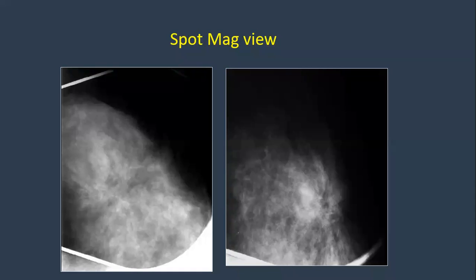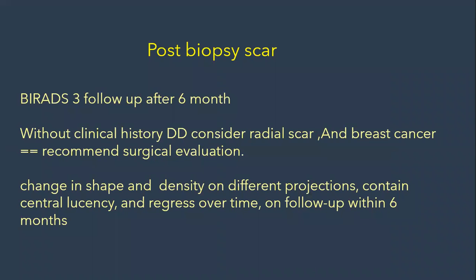Excellent. Well done. 100% correct. Because this is a baseline, and you have change, then you are going to follow. It will be BI-RADS 3. Agree with you totally. This is BI-RADS 3 for short-term follow-up.